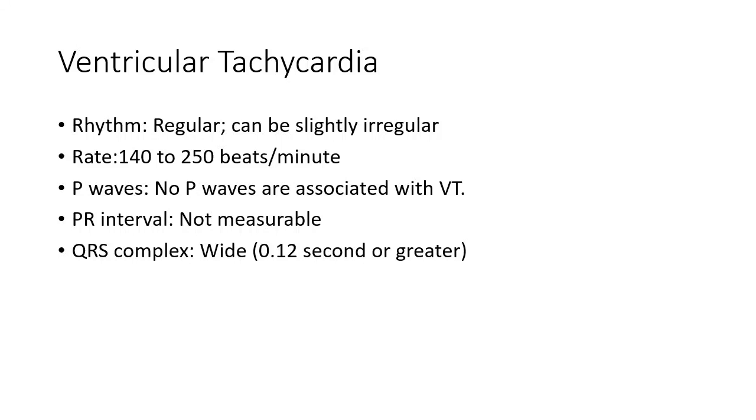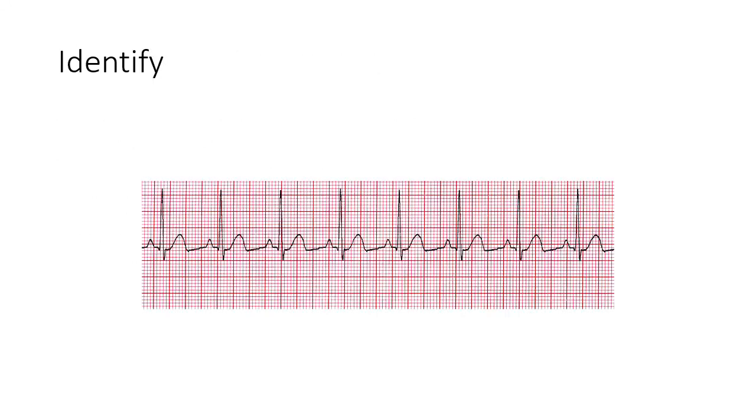Okay. Is this a normal sinus rhythm? Yeah, that's exactly right. It's normal sinus rhythm. Everything is perfectly normal. Okay?